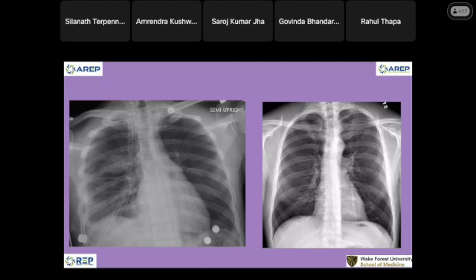Okay, this one is for a young person with fever, pneumothorax, so there's a chest tube draining air out of the chest. So what else do we see here? I think the left lung is not hazy; the right lung is hazy. Some consolidation, like pneumonia maybe, a little haziness.